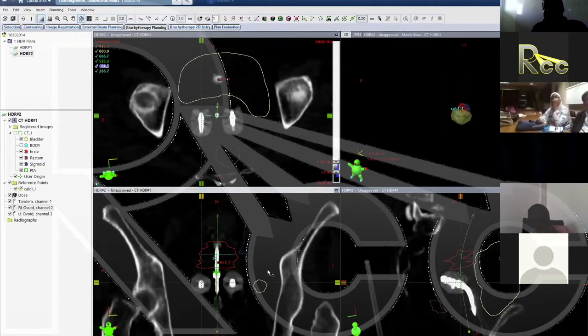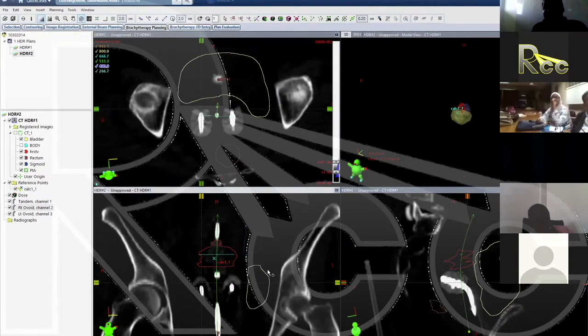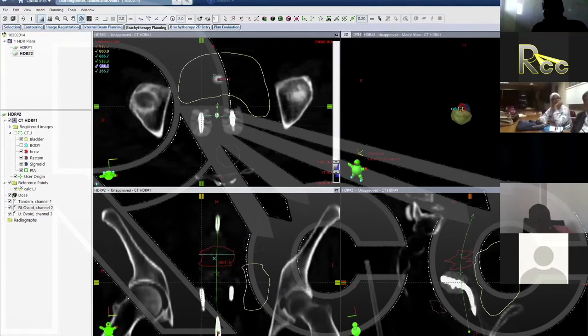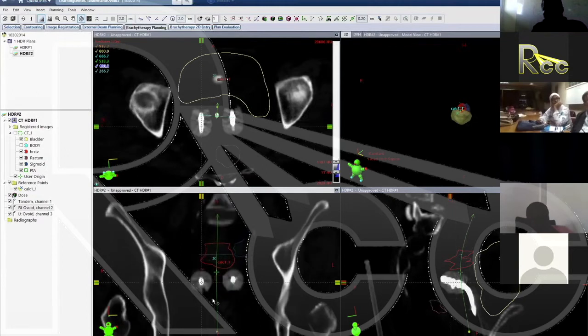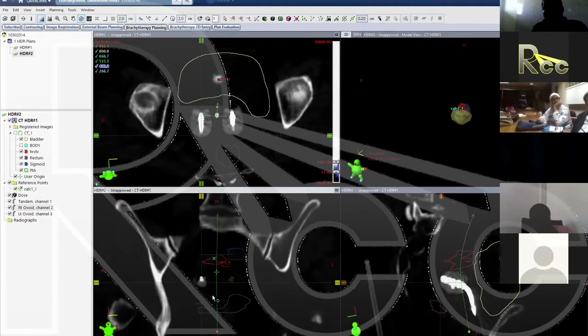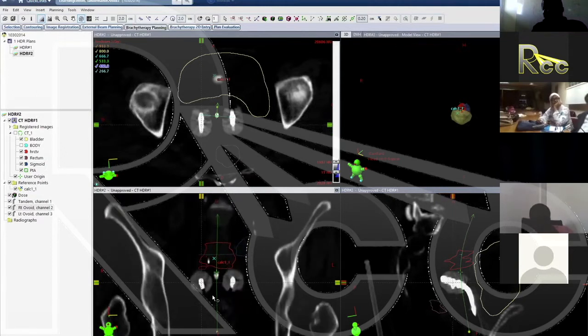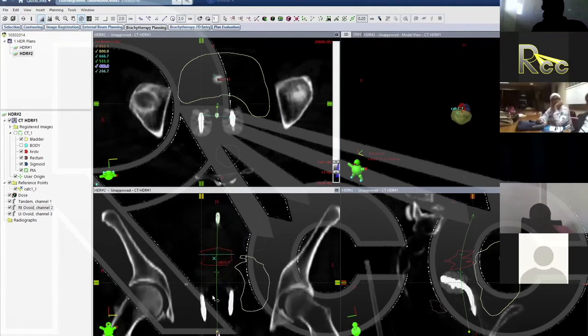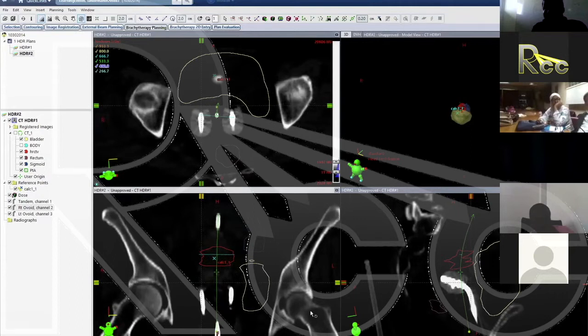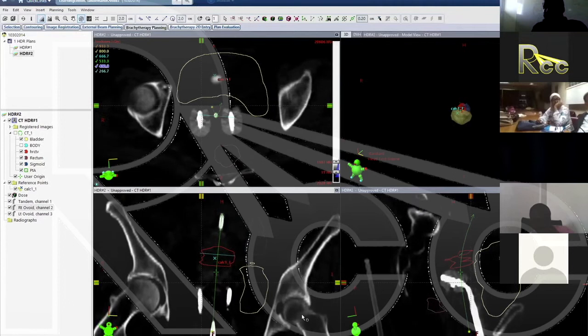and then I'm going to come down to the bottom left image. I'm going to do the same thing. I'm going to scroll through it, and I'm going to see how that ovoid interacts with this vertical viewing plane line. So as I go through the ovoid, I'm really happy with that, and then as I come up here, I can see it's coming off of that line. So we're not going to load here, so it doesn't really matter, but it makes it a lot nicer if we make that adjustment such that everything is really well aligned and we have that really nice viewing plane.